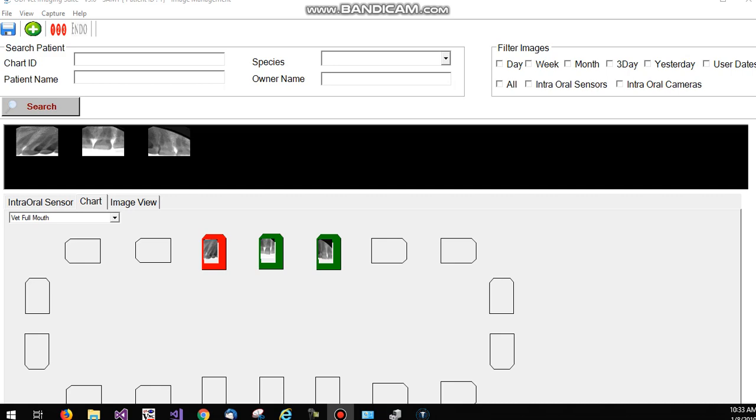Hello ladies and gentlemen, this is part 2 of the demonstration for ODI Vet Imaging Suite with ODI HD Dental Sensor. In the previous video, we captured a series of images using the teeth chart. In this video, we'll show you the rest of the features of this software.